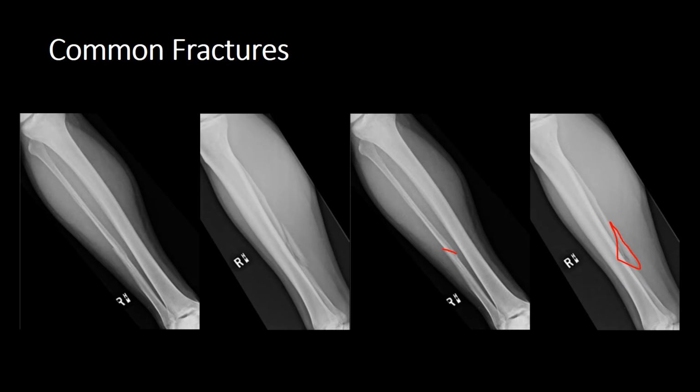And now we have full-length tibia and fibula views, and we can see much more clearly now that fracture of the fibula, which has occurred around about the junction of the mid to distal third of the diaphysis of the right fibula. So this type of injury is called a Maisonneuve fracture, and what that means is that you have an injury to the ankle joint and a fracture, usually of the proximal fibula further up. And it's important that you do recognise that this injury in the ankle joint to ensure that we don't overlook the high fibular fracture.